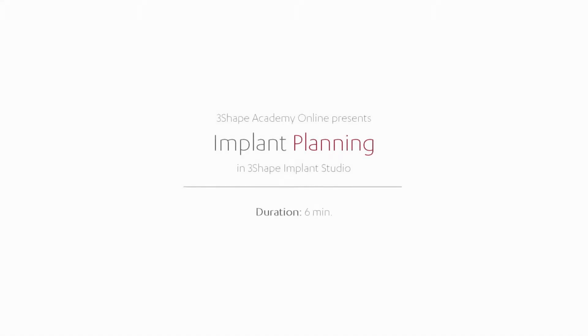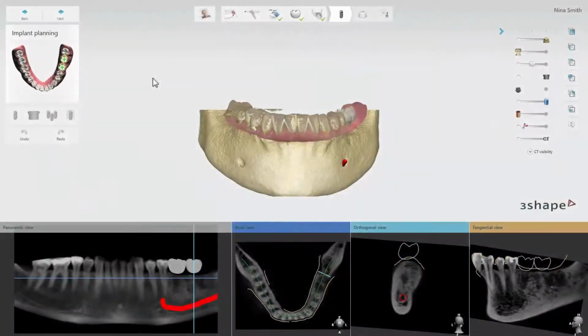How to plan an implant placement for a tooth-supported implant case in 3Shape Implant Studio. Before this step in the workflow, you have already imported scans and designed the anatomy of the tooth. Please see the previous videos in this series, Tooth-Supported Implant Planning, for more information.